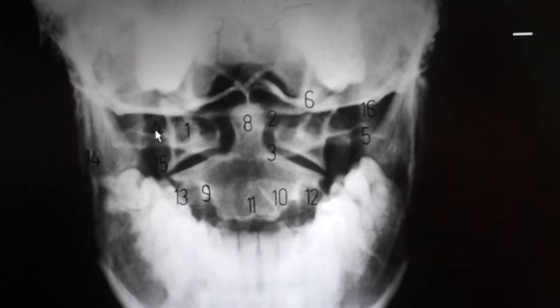Number 4 is labeling this oval shape right here, which is the transverse process foramen of C1. Notice that the foramen itself goes all the way out to right here, and here is part of it coming in right here, so we can just barely see part of that foramen. That is number 4. Number 5 on the other side is labeling the transverse process, and again it is all of this going out to here, and here's the top of it right there. All of that is the transverse process, and right here this dark area is the transverse process foramen.